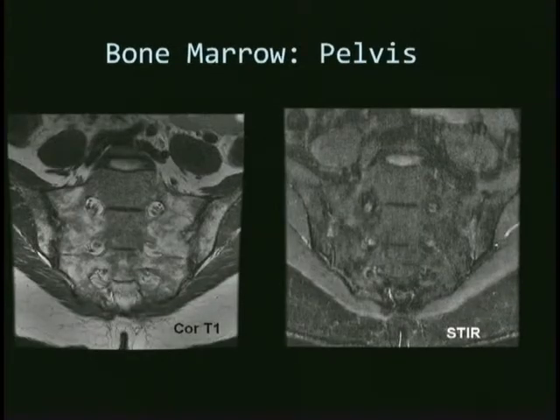In the pelvis, it is the axial skeleton, so the bone marrow persists throughout adult life, and often in a patchy way. Sometimes people think it looks abnormal, too heterogeneous, but in the pelvis it's a very common finding. So if you see that the marrow has a patchy appearance, but the signal intensity is right for red marrow, it's a normal finding.